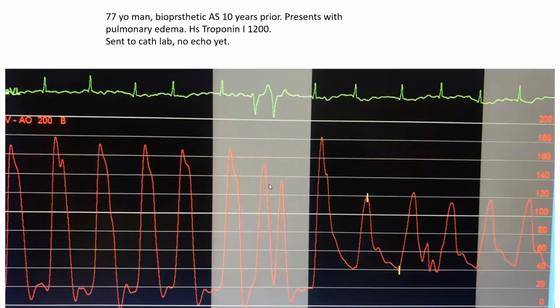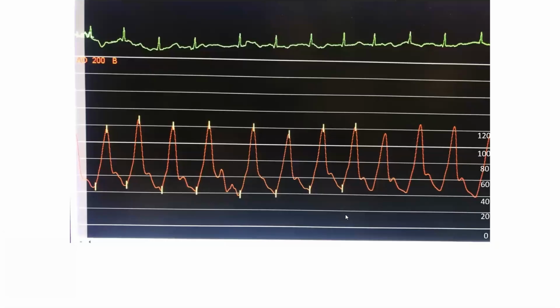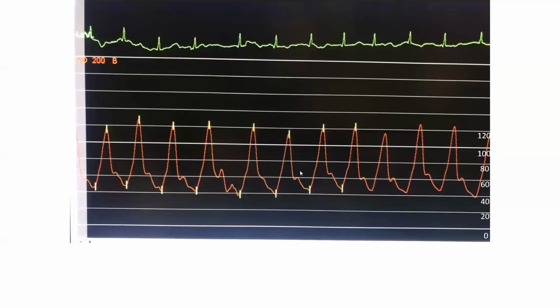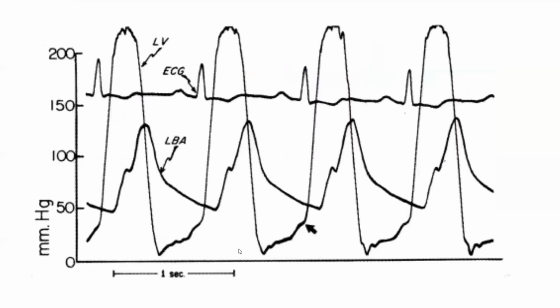For example, this patient I just showed earlier had severe AI, had an anacrotic notch, and had a pronounced dicrotic notch. So having a dicrotic notch doesn't rule out AI. Not having it on a properly damped waveform, especially while you have an anacrotic notch and other morphologic features of AI, is further support of AI. In this patient, lack of dicrotic notch supports AI, specifically acute AI.